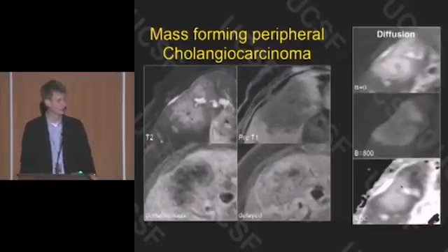Okay, it's not classic. You couldn't hammer down on this being a definitive diagnosis, but the target appearance should definitely bring to your mind a cholangiocarcinoma.